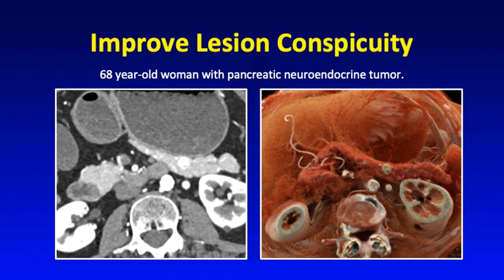But when you look at the cinematic rendered image, with the increased depth perception and the photorealism, you can really make this lesion pop against the background pancreas and greatly improve the lesion conspicuity.